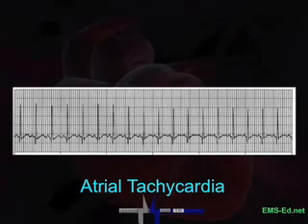Etiology? Well, it's a variant of sinus dysrhythmia, which is a natural phenomenon in the very young or old. It may also be caused by ischemic heart disease or atrial dilation, something we could see more clearly in a 12-lead EKG. There's not really much of a clinical significance, but it may be a precursor to other atrial dysrhythmias. Let's look at some dysrhythmias that might be more serious.